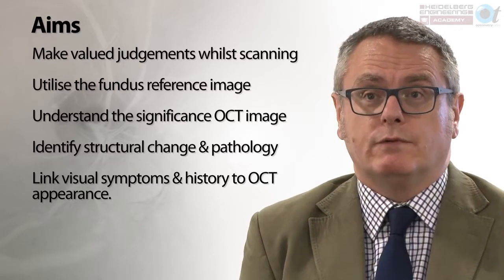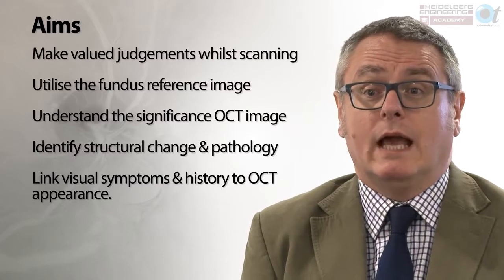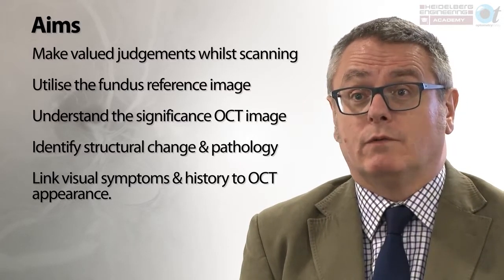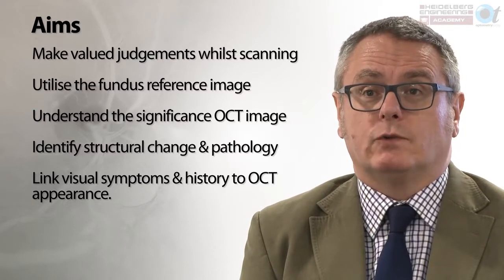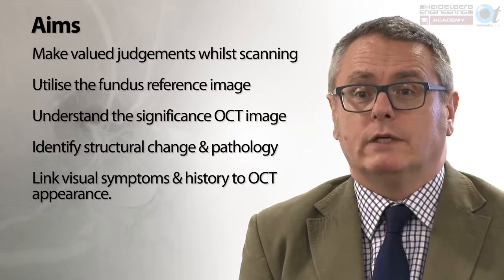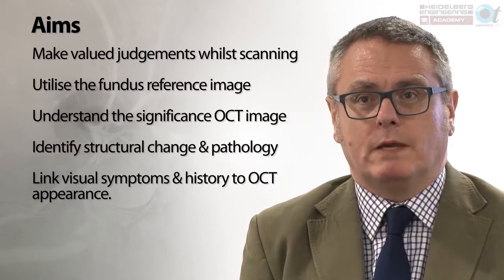To utilize the fundus reference image to give you clues as to where the OCT scan should be placed and to understand the significance, obviously, of what you're seeing within the OCT image. And then to identify structural changes and pathology, and then to link those changes to visual signs and symptoms the patient may be experiencing.